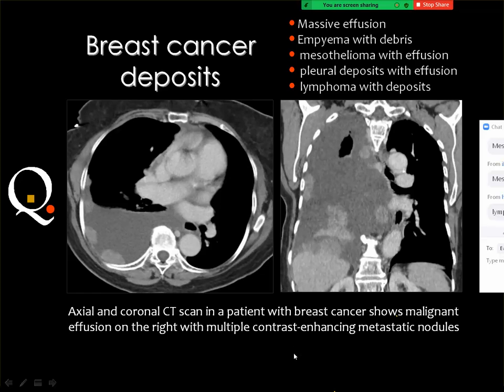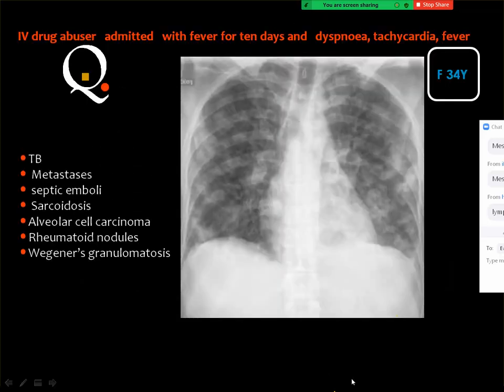Then whenever, at what time you will say that this is lymphoma, if you see any stigmata of the lymphoma in the film or in the clinical practice.